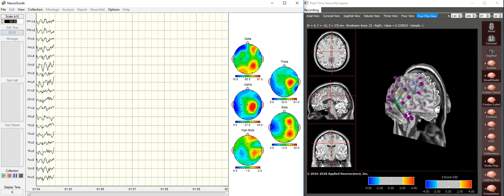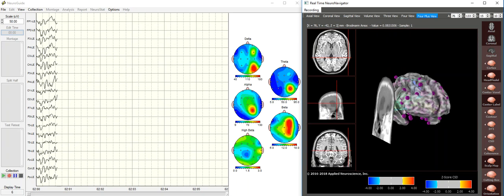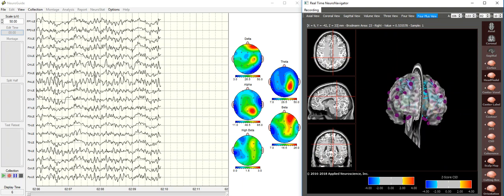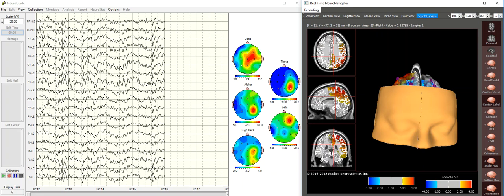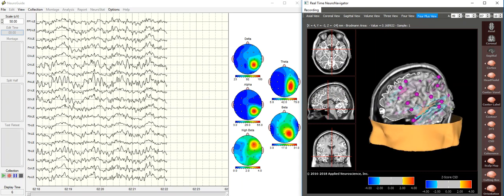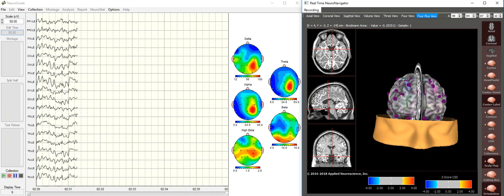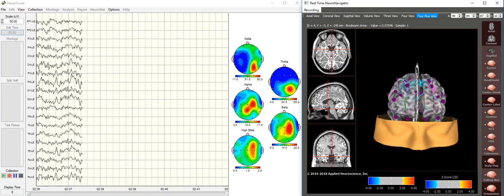And you can see the EEG that way, but you will also be able to see the three-dimensional sources, as well as the connectivity changes in your clients in real time, and be able to move through the plane of your client's brain while you're evaluating it, and even possibly doing real-time neurofeedback by looking at different networks, attention network, memory networks, etc.